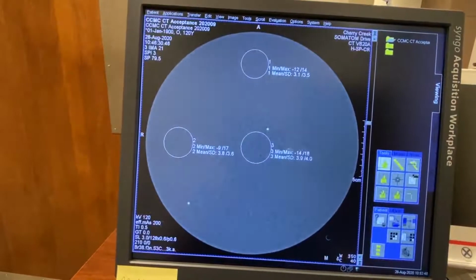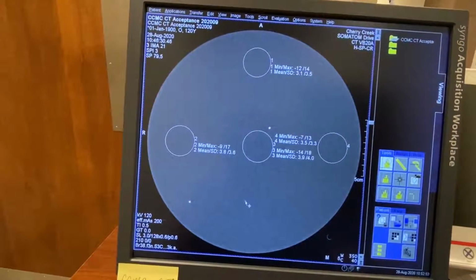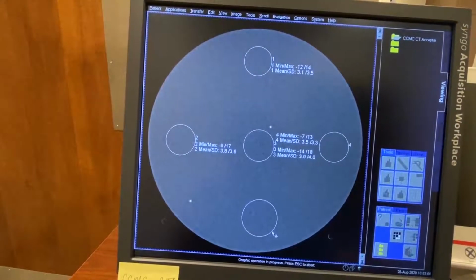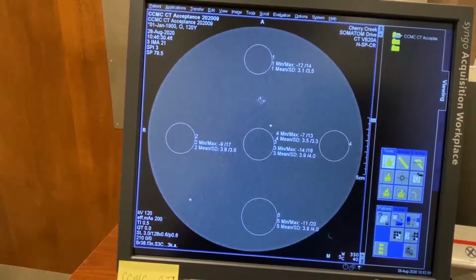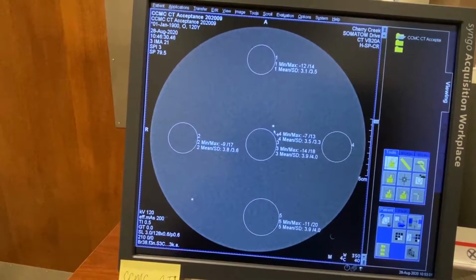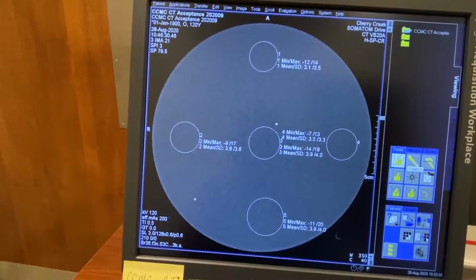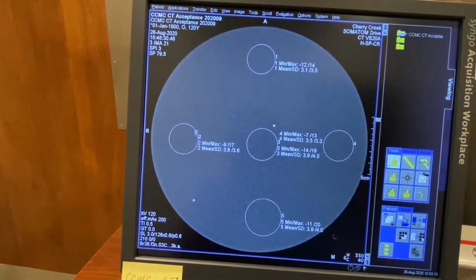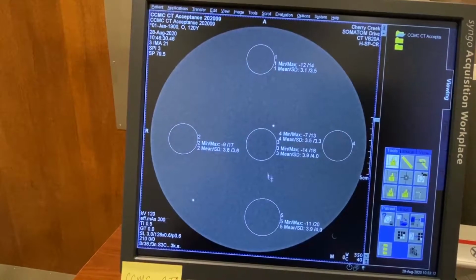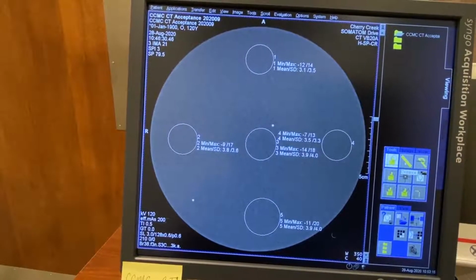We measure 5 different areas, and we want to see the mean and standard deviation of these 5 areas, to see how much deviation there is among them. Because the material is uniform, we expect all these 5 areas to report a similar mean. And there's another function.